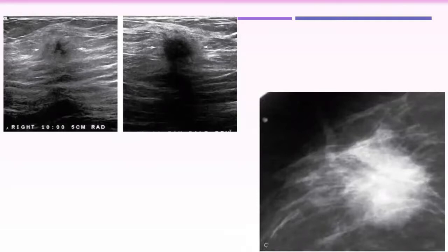On mammography it is highly suspicious, but the ultrasound follow-up signifies that this lesion is downgraded. On mammography I give it BI-RADS 4B or 4C, sorry, 4C or 5. Yes, it is almost 5. But on ultrasound follow-up, it was suspicious, but the patient might disappear for any reason.